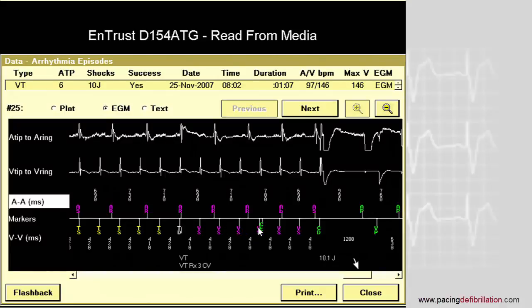But as you see here, I think that the charge duration is much less determinant in the VT zone than in the VF zone in terms of risk of syncope. Since, like in this example, the shock is being delivered after sometimes more than 1 minute, corresponding to the different ATP sequences, the few seconds difference in the charge durations between a shock of 10 joules or maximum output in the VT zone are probably not determinant clinically.